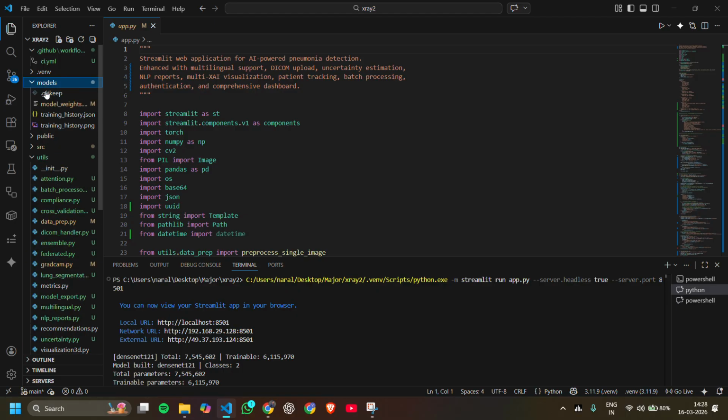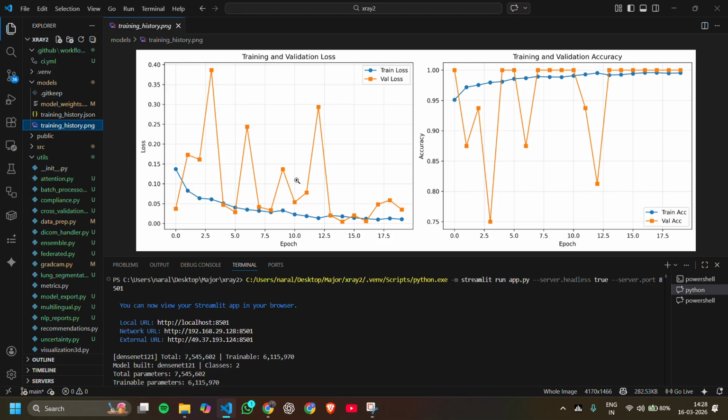This is our training history, training and validation loss.